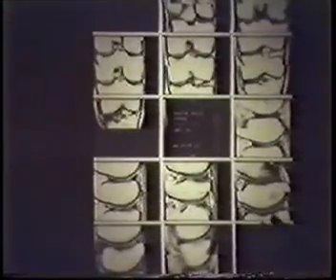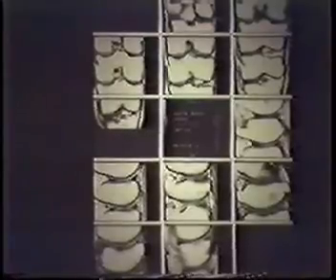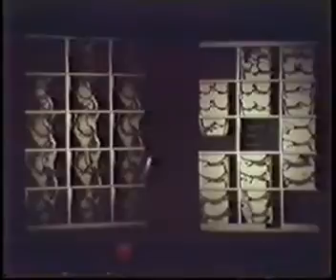We like to photograph the knee in both soft tissue windows, and then we like to have very narrow window widths, magnified, high contrast views to evaluate the menisci. So we like to image all the images through the knee with soft tissue windows, which give nice, pretty images. And then we like to do an optic magnification by a factor of 2 and have very narrow window widths, which on our machine we have the window widths around 80 to 85, and just photograph the menisci. These images allow much better visualization of any signal abnormalities within the menisci than these images over here.